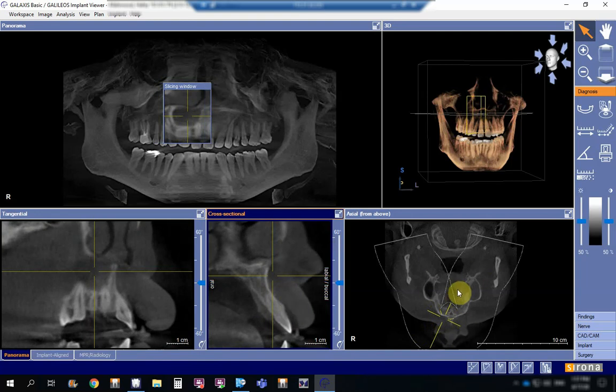But if you go into the axial view, then you will have the chance to examine the area from the lateral to lateral, passing through the medial areas, and then you will also have the chance to navigate from the anterior to the posterior of the patient, as you're going through the different layers in an anterior-posterior direction, so you will not miss anything, and at the same time you will have the whole image being seen in a single view.